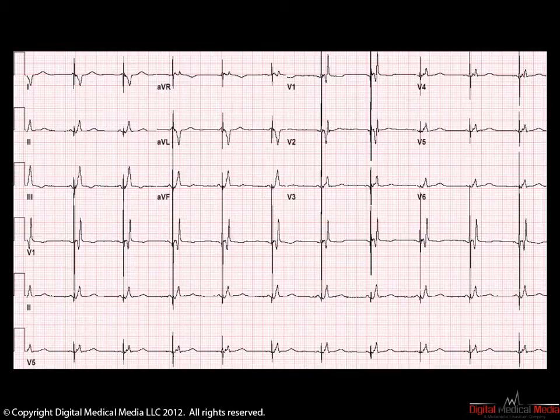cardiac resynchronization therapy. By pacing both the right ventricle and the left ventricle concurrently or in sequence, we can narrow up the conduction through the chambers, resulting in a more narrow QRS. The clues to this are the fact that the QRS is relatively narrow and lead 1 is downgoing. Lead 1 being downgoing means that the vector of depolarization is moving away from the left arm and towards the right. This can only happen if the source of the signal is beginning in the left ventricle.